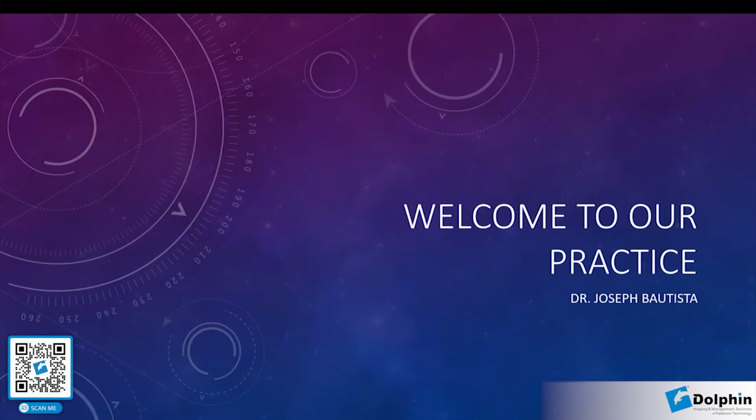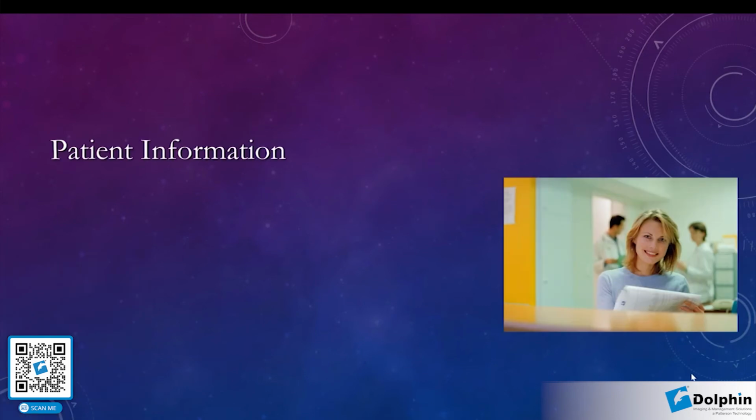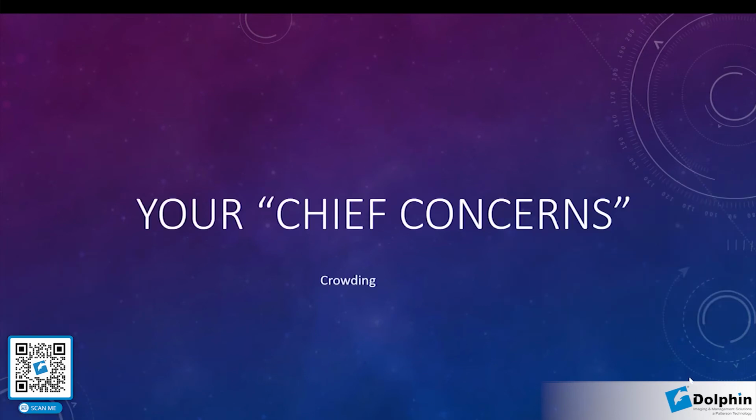This is just a custom PowerPoint that I've created here for Samantha Jones. And of course, you would put in your own content, your own templates here as well. So it pulls all the tokens from the questionnaire in here.